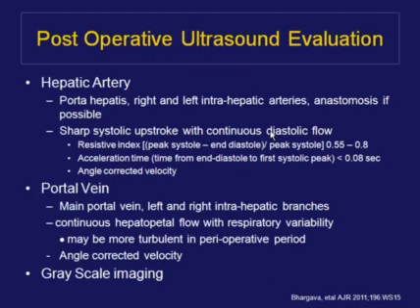Postoperatively, a variety of things are evaluated in a sonogram, but we're going to concentrate on those problems related to the hepatic artery and the portal vein, supplemented by grayscale imaging that can be useful in this regard. There are many interesting things that happen hemodynamically in the immediate postoperative period, the perioperative period, and then eventually thereafter.